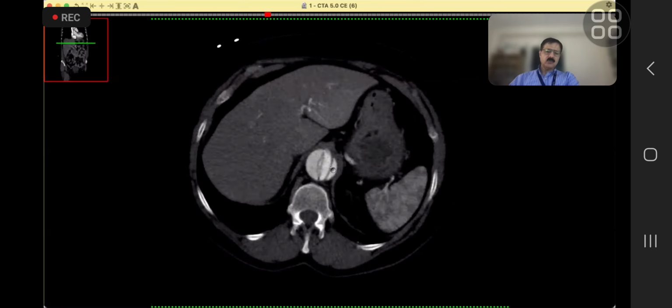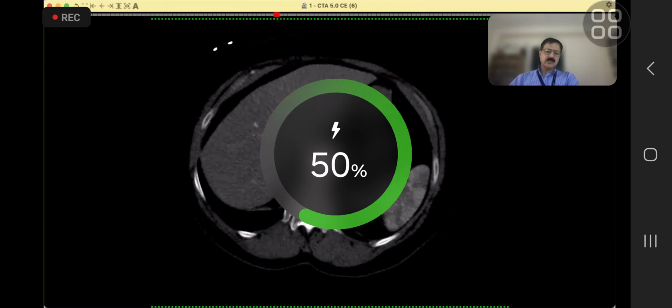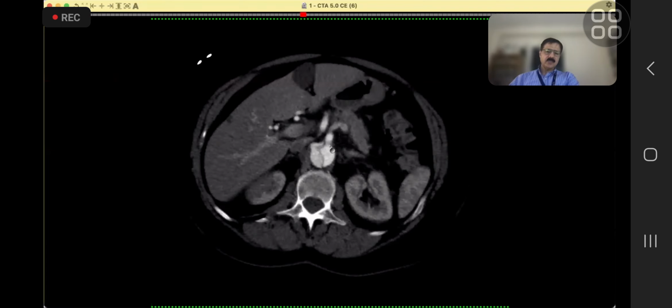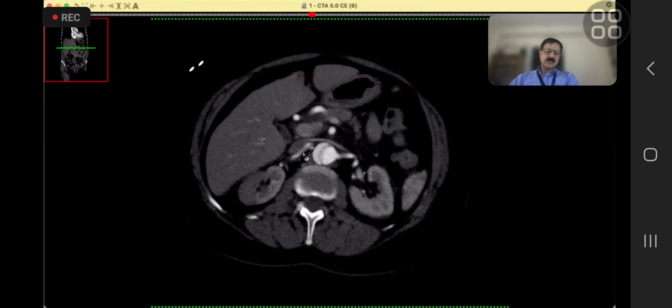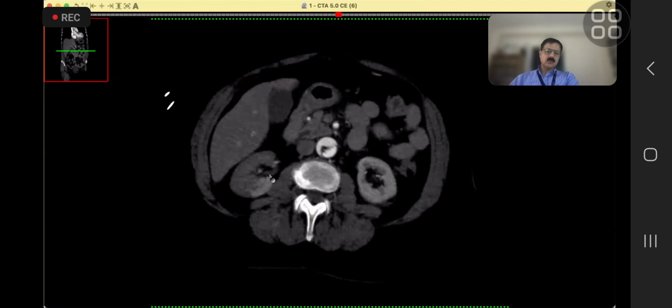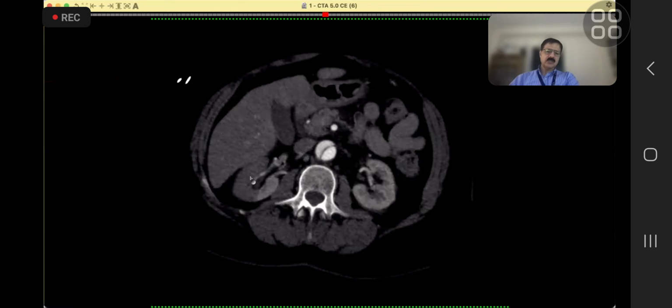It was very well described by the candidate: the celiac artery, and then the SMA. The key thing is that the false lumen is supplying the right kidney, and the right kidney's health is not good. It is an infarction in evolution. Here, corticomedullary differentiation is seen. Here, it is not.